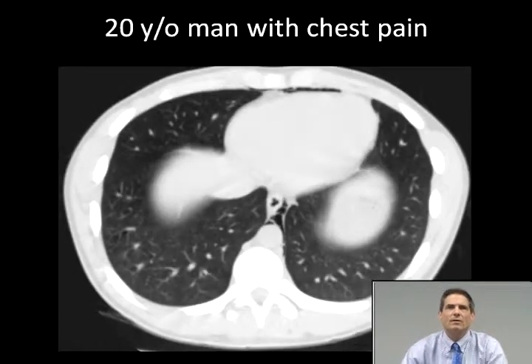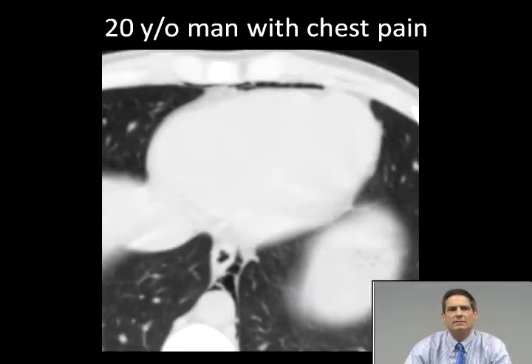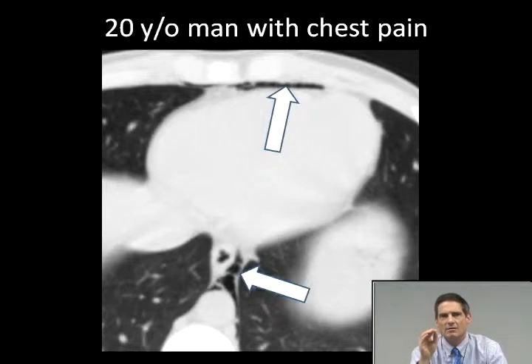Slide 54, without arrows, and slide 55 here with arrows shows you air along the esophagus, and finally slide 56 and 57 with the arrows shows you air along the anterior aspect of the heart, causing the abnormality on his lateral chest x-ray, and some air there along his esophagus posteriorly.